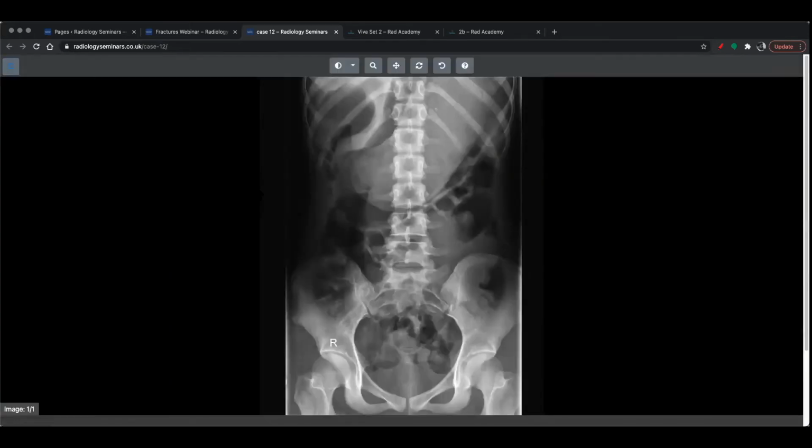So this is a bit of a fun one. I like this one a lot, okay? So you guys tell me what you think is going on. Please feel free. I'm going to give a clue, a bit of a riddle, for people that don't know. This patient was one of twins, and one twin was losing hair and the other one had stomach pain. So hopefully that gives it away. So abdominal pain, essentially, is what's going on. Feel free to write down what you think. If you don't know, no worries. I'm going to work through it.